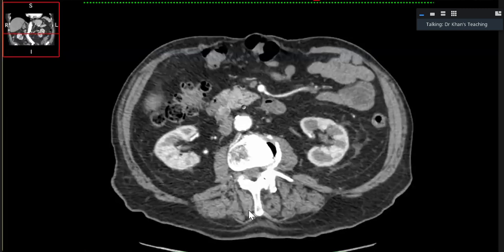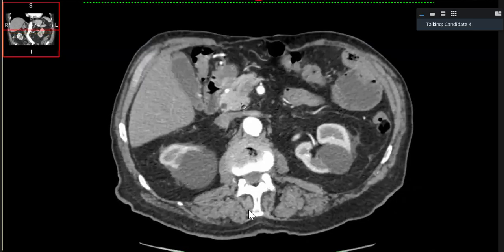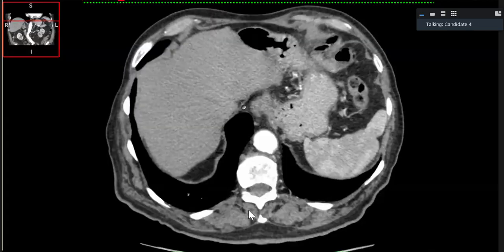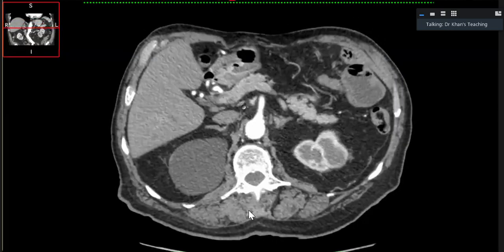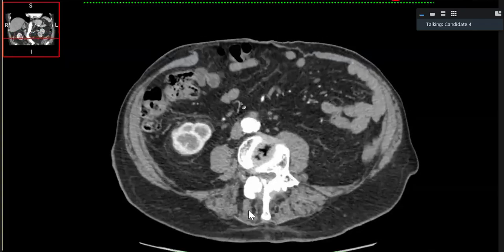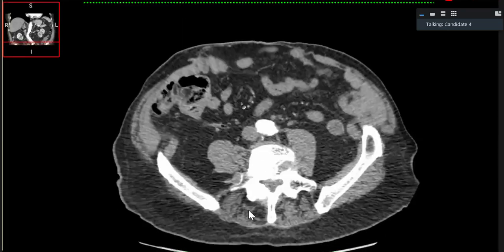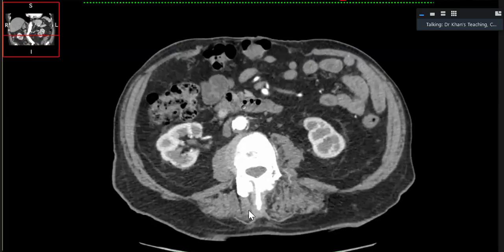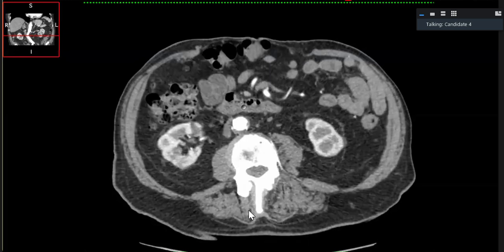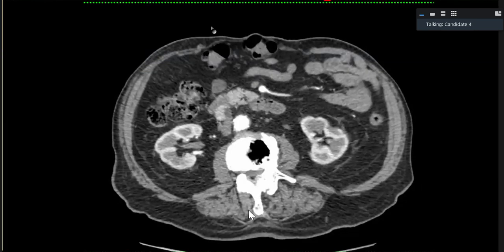Okay. What else? To rule out any enhancing lesions in the liver, which I couldn't appreciate. And what else? And any tumor in the mesentery, to see other associated neuroendocrine tumors. Final conclusion? So it's a neuroendocrine tumor close to the duodenum. Yes.